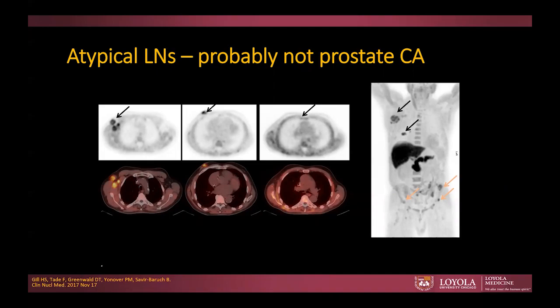On the contrary, we do have a patient with right axillary lymphadenopathy, small right breast lesion, and an internal and intramammary lymph node, as well as bone lesions you can see on the right side on the MIP. So clearly this is an atypical presentation. It's likely breast cancer, and it was proven true by biopsy to be breast cancer in men.